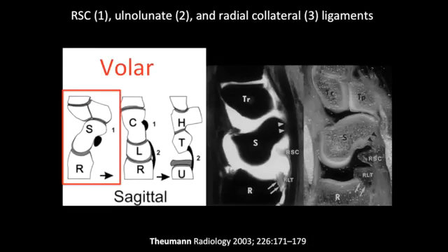On our sagittal images, as we go from lateral to medial, along the volar margin, we'll catch portions of the radioscaphocapitate ligament that extends into the capitate. So here is the radioscaphocapitate. We also see portions of the radiolunotriquetral ligament more inferiorly.